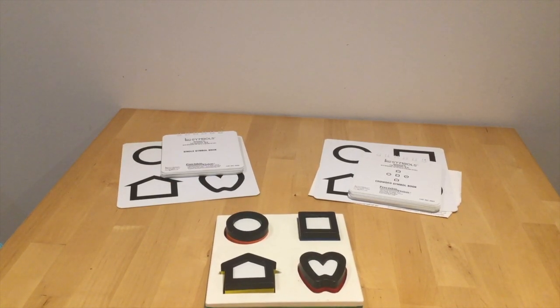Two more distance assessments, this time by Lea Hyvärinen from the Precision Vision Kit. Try saying that quickly. And also in the front we have a puzzle. Now you may remember from the near assessment practice video, in the BUST assessment, the blue set, I said it was quite a good idea to get children used to those shapes because they appeared in other assessments. Well, here are these shapes again.